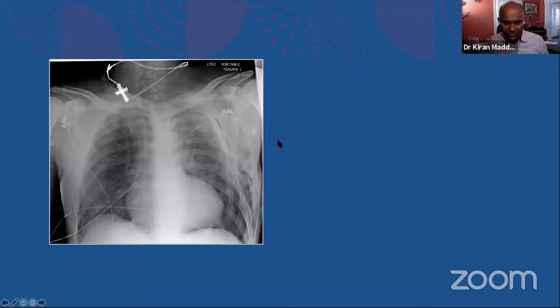Emphysema, very good. It has emphysema, right? Excellent, Salim. That's an excellent job by Salim. So he nailed it.